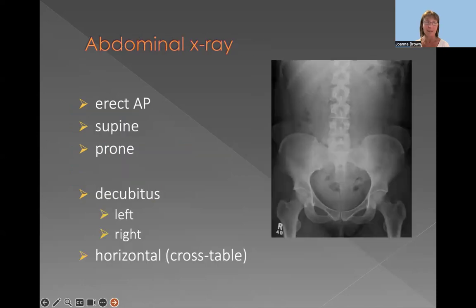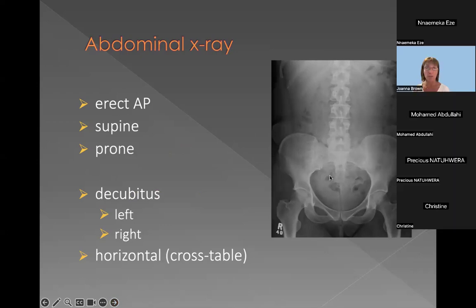before taking the X-ray. So with the abdominal X-ray, we can do different projections, and this will be up to our radiographers. But for us doctors looking at the X-ray, it will be important to know the difference because different pathologies can look different on different projections. So when we have older children or teenagers, and if we have adults, then we usually have the erect X-ray. We can have it supine or prone, and this is how the X-ray of the abdomen will look.